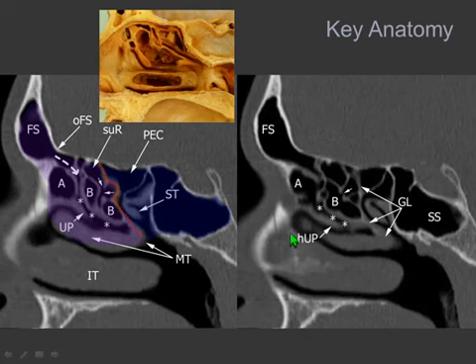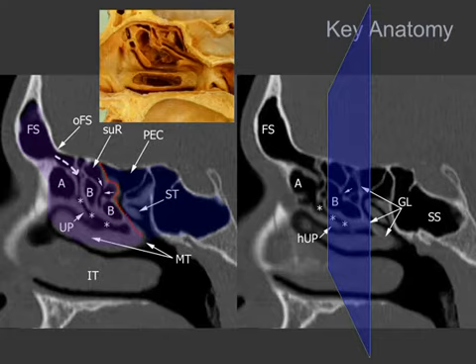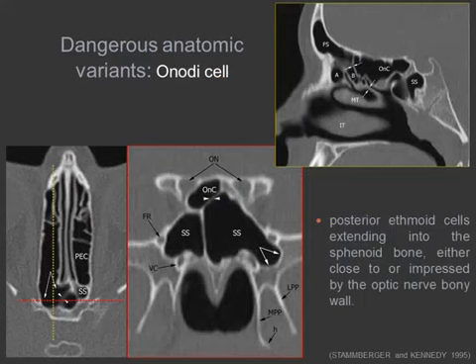And it is very important to notice that we are looking at those structures in the sagittal plane. Why? The coronal plane is also very important, but the sagittal plane, for example, will give you this type of information. There are situations in which the competition for the space is won by the posterior ethmoidal cells, not only in an anterior direction, but also in the posterior direction.